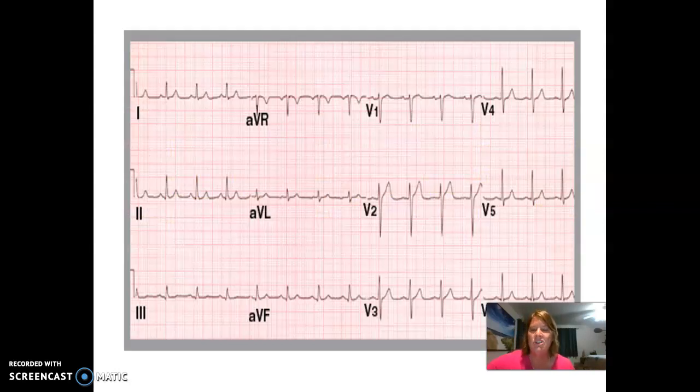Now, on a 12-lead ECG, again, in this class we're not going to learn how to read 12-lead ECGs. We are looking at one-view monitoring, but I wanted to show you how things can look different depending on what lead you're looking at. So we tend to put our patients in lead 2 because that gives us a nice upright tracing. V1, which is equivalent to our MCL, you can see that here my P wave is going part up, part down, which we said can be normal for MCL. My QRS, I've got a little tiny R but a nice deep S wave. That's normal in an MCL. So this is going to tell you what your heart's doing from multiple different views.